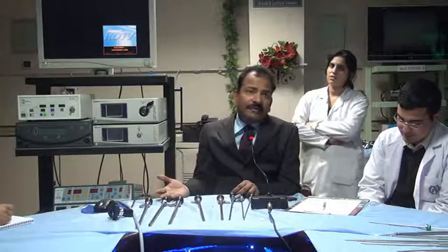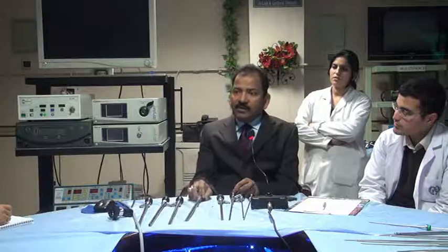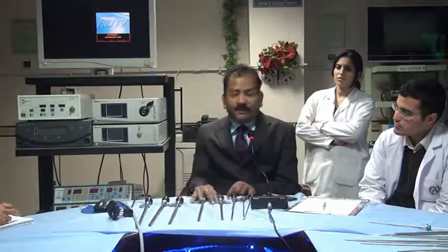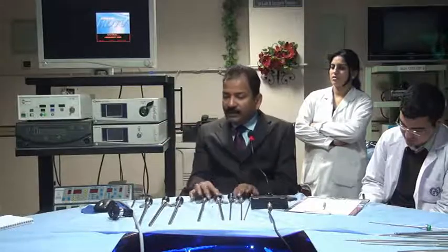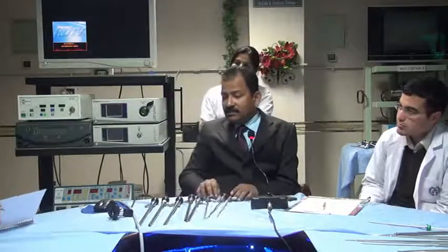But in laparoscopy, we are losing it. Why? We are using only one eye. So in Da Vinci or in robotics, you have two rod lenses, so it gives you complete binocular vision. 15 mm is also used sometimes for cancer surgery and all, with a big field of vision and better magnification. So first is diameter. If the diameter is less, what will be the problem? First, restricted means, what is the meaning of restricted?